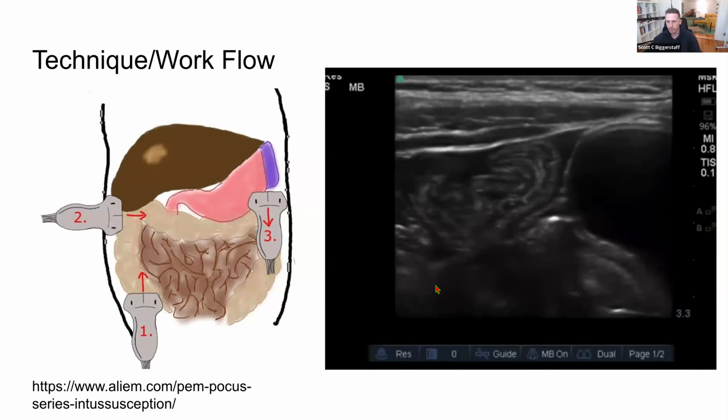You review the images from the appendiceal ultrasound, and this is what you see. Conveniently not commented on.